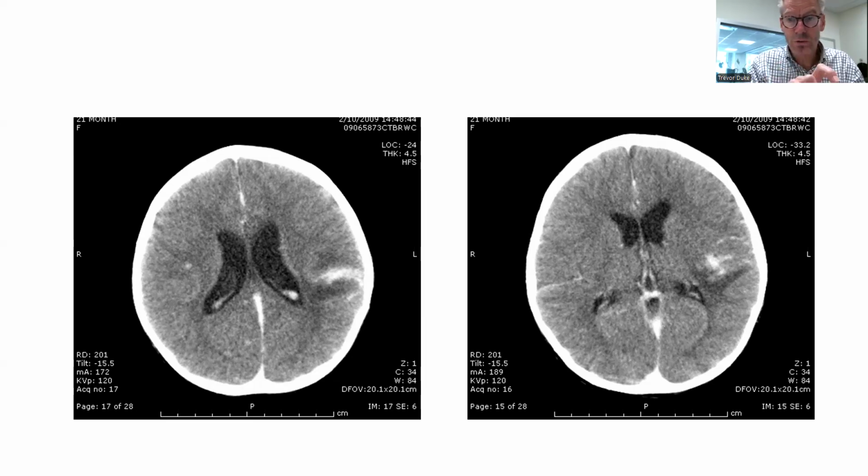and then there is a focal abnormal hyperdensity with contrast, then it suggests that there's not a hemorrhage, but there's high vascularity, because there are blood vessels that are being highlighted by the injection of contrast. And so this is a situation where these are both contrast enhanced CT scans, and this is in a child who's got TB meningitis, so tuberculosis meningitis. And you can see several things from this.